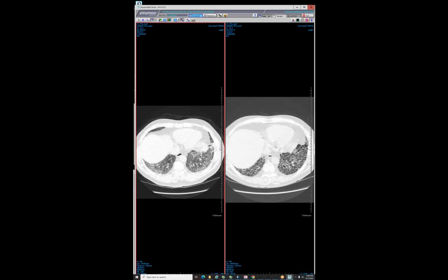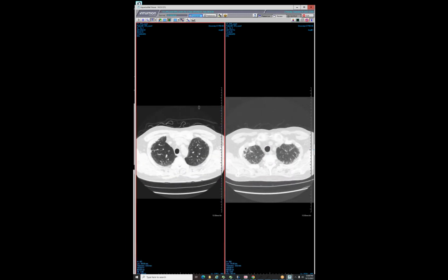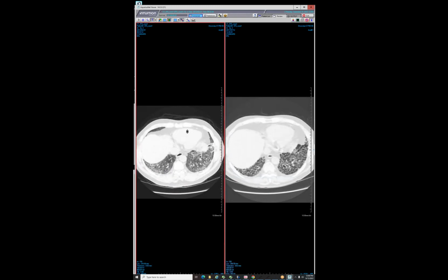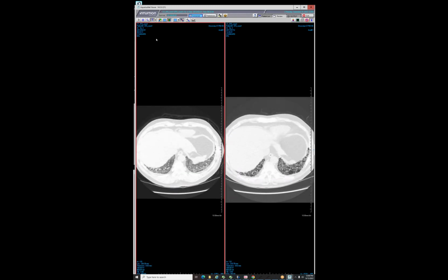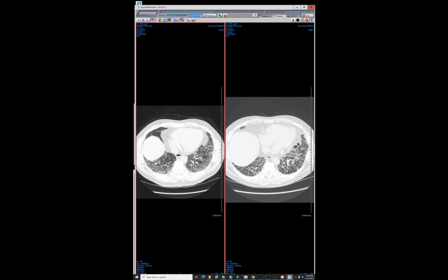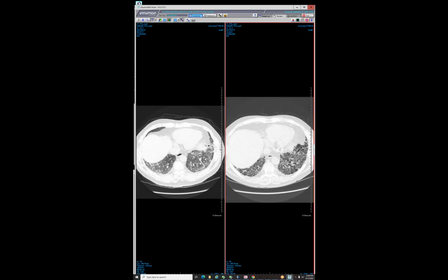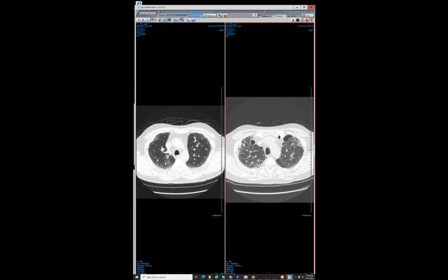Jeff's point's really important, that the best imaging for interstitial is the earliest imaging. Yeah, and you always have to go back, and that's what's great about PACS now. You can see this case, the initial one was from 2013. This was just a post-lung transplant x-ray I was following up. And of course, I always go to the first study. I said, oh, it looks like NSIP. And then I pulled up the next CT, which we had, which was just 2017. I was like, oh, look at that. And then looked at his biopsy results and then his explant results, and it was pretty nice.